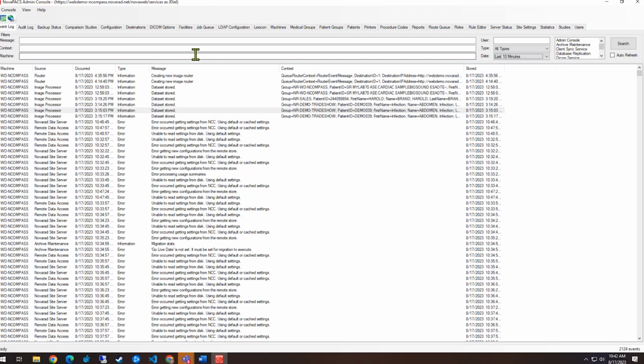Or if you just have one user that's struggling, you can do the similar with the user.